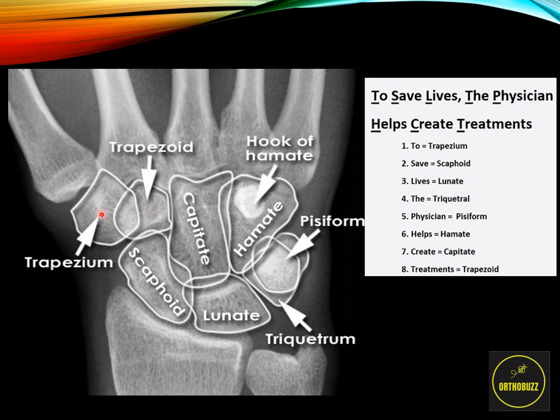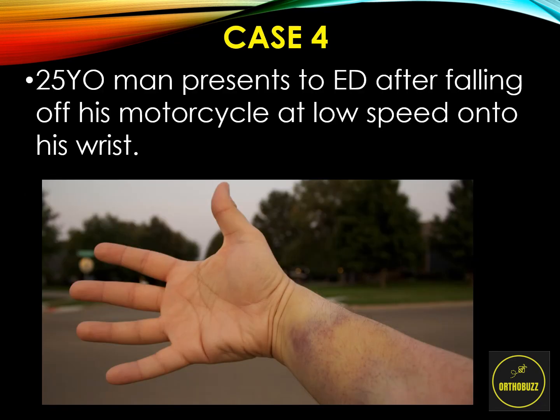So, trapezium, scaphoid, lunate, triquetrum, pisiform, hamate, capitate, and trapezoid. So let's look at a case.